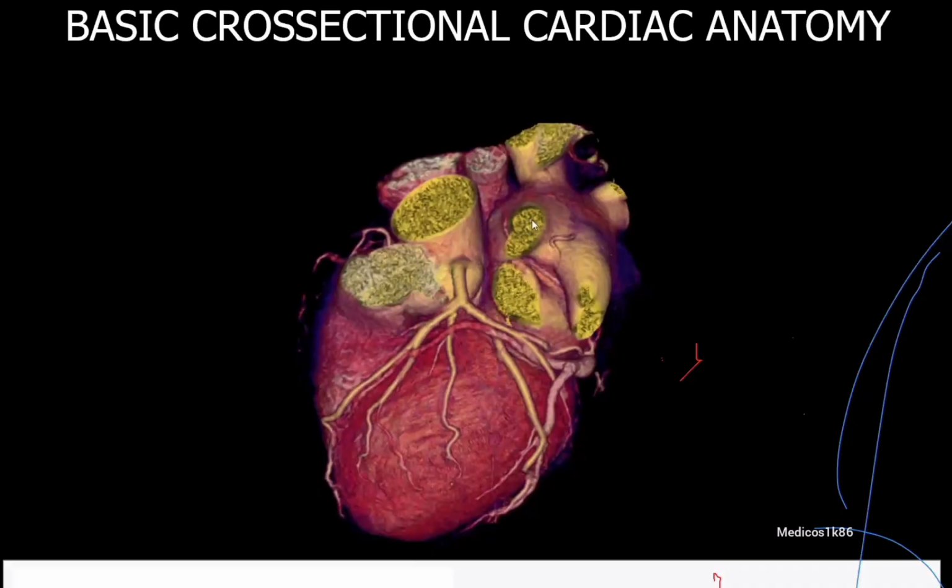As you see, this is the 3D image of the heart. You can see some vessels, big vessels and small vessels. And the small vessels are all the cardiac artery and the cardiac venous system. Of course, this is a 3D image. And there is a heart orientation, as you know. The heart is not shown as you see on the screen. It is oblique, a little bit positioned on the left side. Because of this, the cross-sectional, the axial images, are not showing like this. It is totally different.